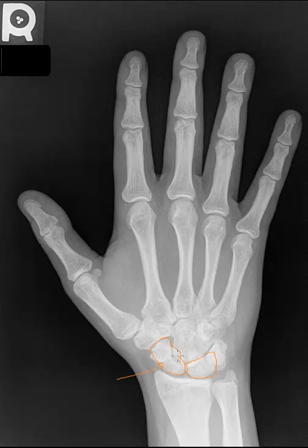So scaphoid, lunate. Now these 2 bones here are going to be sitting on top of each other. The bigger of which is going to be the triquetrum, and the smaller, rounder one of which is the pisiform. Now the pisiform is technically a sesamoid bone and does live in a tendon. Overlap of the pisiform and the triquetrum is very, very common on PA radiographs.